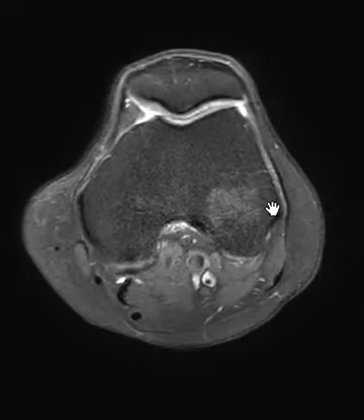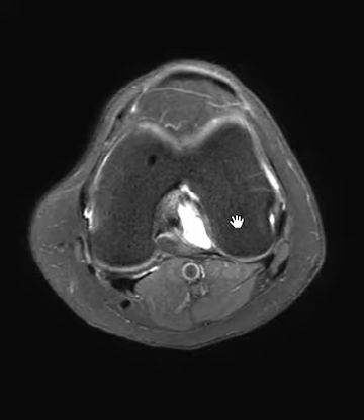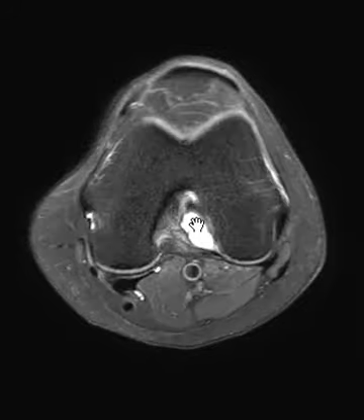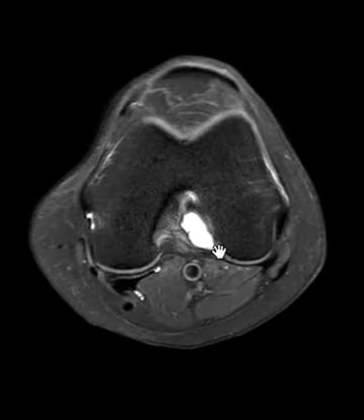And we see here on this axial image that she has a collection of fluid in the middle of the knee. So this is the kneecap in the front, this is the back, the popliteal area, and right in the middle, this is the femur, this is the intercondylar notch between the medial and lateral condyles. We see this white thing here. This is a fluid collection intimately involved with the ACL.